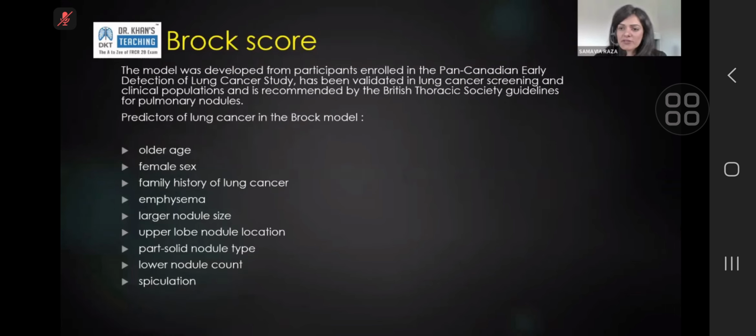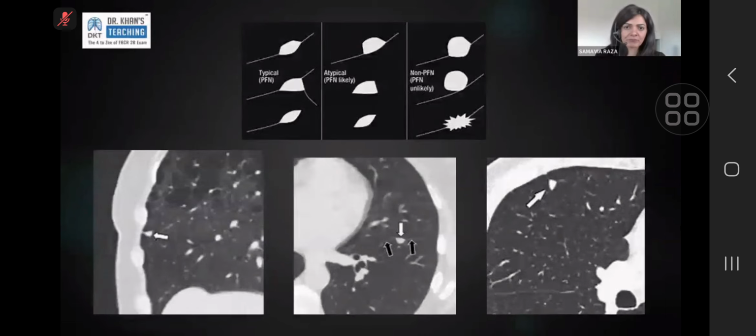You can sometimes convince yourself that you see that in infection. The way to remember it for lung cancer is that when you see a nodule that is spiculated, it means it is infiltrating into the lung around it. And when that lesion is next to a fissure, it inevitably pulls the fissure. So that's a very suspicious marker. If you see a CT and you do a coronal or a sagittal reformat and the nodule is actually pulling the fissure towards it, it implies malignancy.